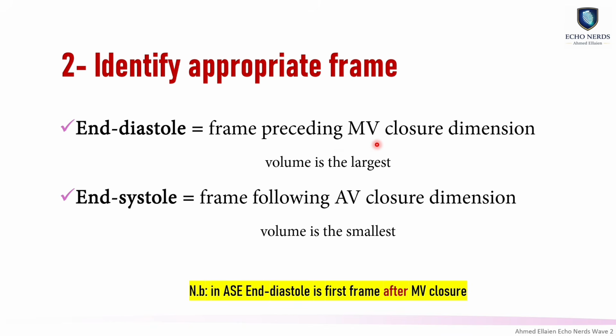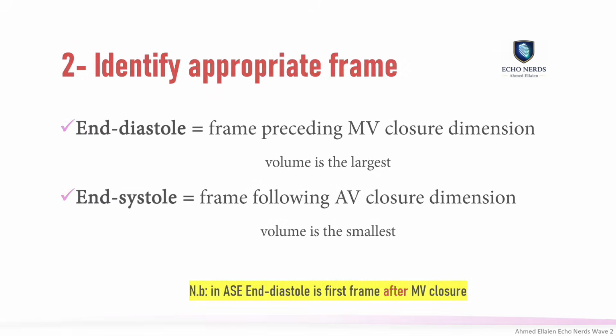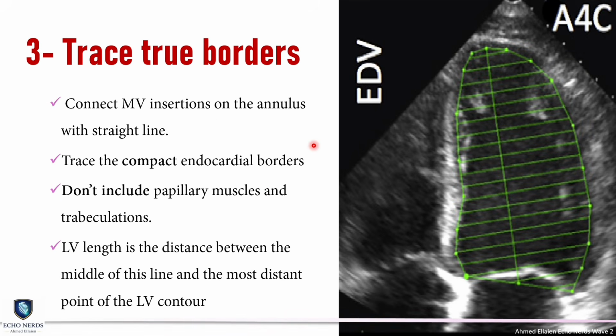For your clinical practice, the most important is not before or after the valve closure, but the largest dimension and the smallest dimension. So try to move the frames of your image until you get the largest, widest frame and the smallest frame and do the measures at them.